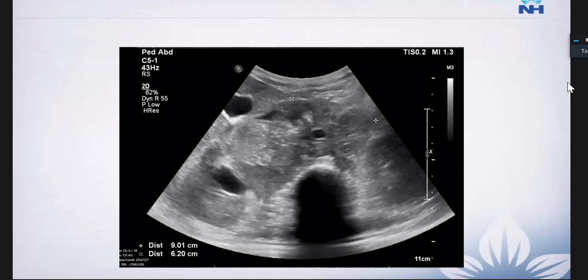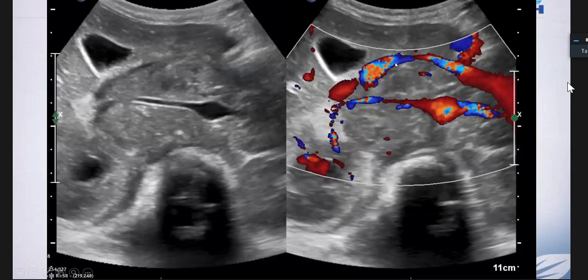And when we saw the USG abdomen, it was quite frank that there was a lesion in the retroperitoneal space. You can see that centrally this is the aorta, this is the vertebra, and a lobulated heteroechoic mass lesion was there in the retroperitoneum on both sides, which was uplifting the aorta and encasing the major vessels of the abdomen and mesentery.